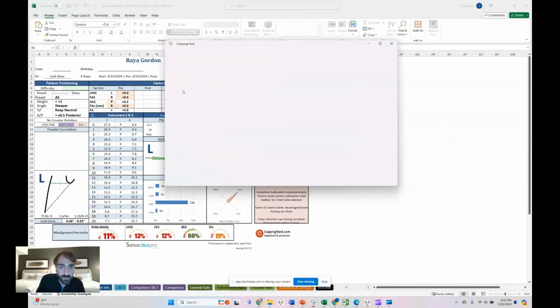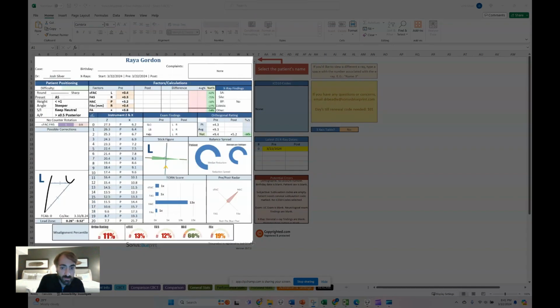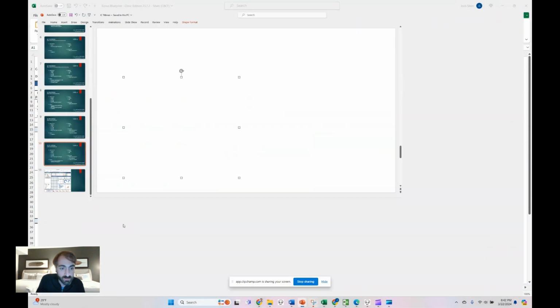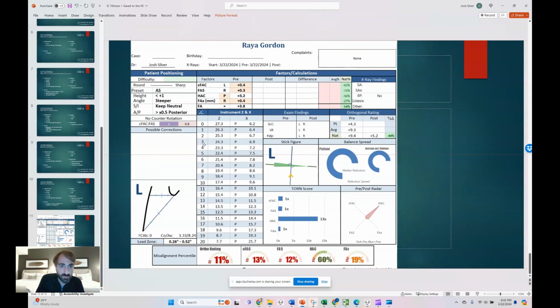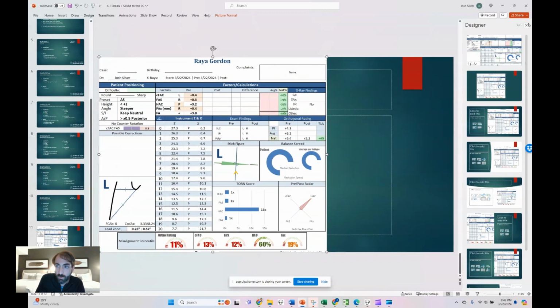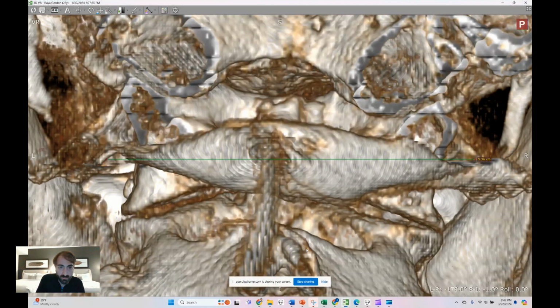What I like to do is go ahead and snip this, and then we'll post it usually right into the PowerPoint. So like this. Okay, cool. Let's get a show misalignment shot for this. Refresh.